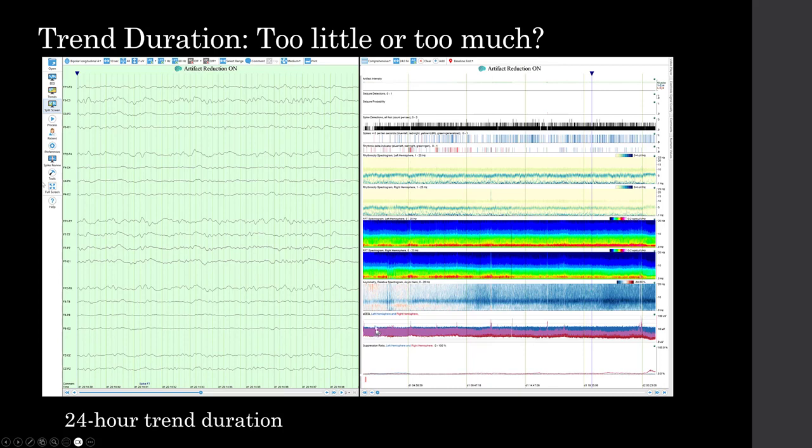And that shows up most prominently in the AEEG display, where we're showing left hemisphere in blue, right hemisphere in red. Pink is overlap, and so we have higher amplitude on the left, and as that right hemisphere EEG drops in amplitude, that overlap decreases, and we see that blue increasing across, and we see the red increasing along the bottom edge of that. So this is an example where zooming out can be helpful.